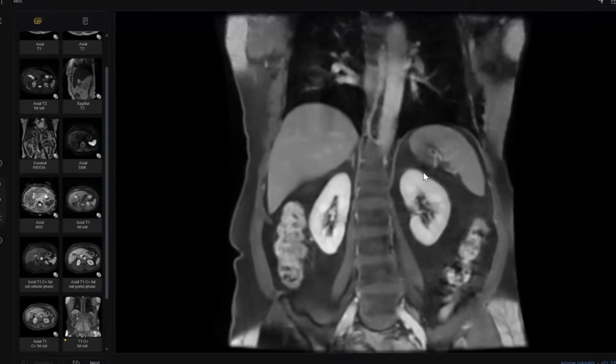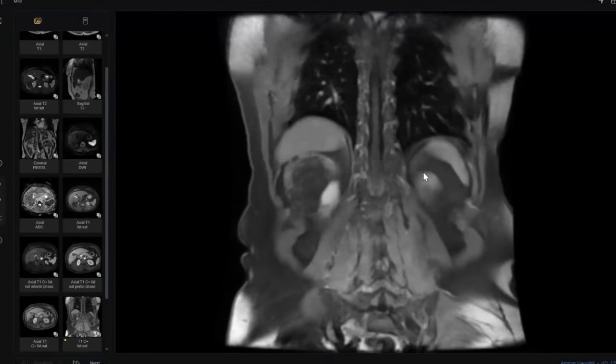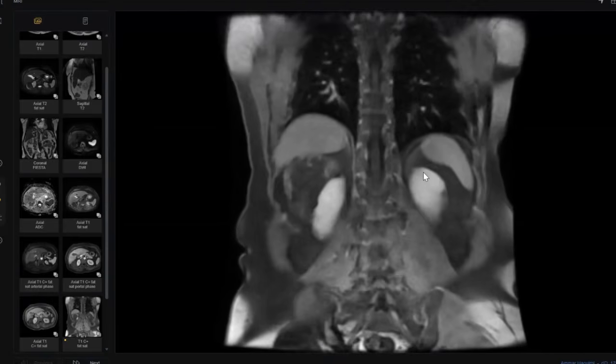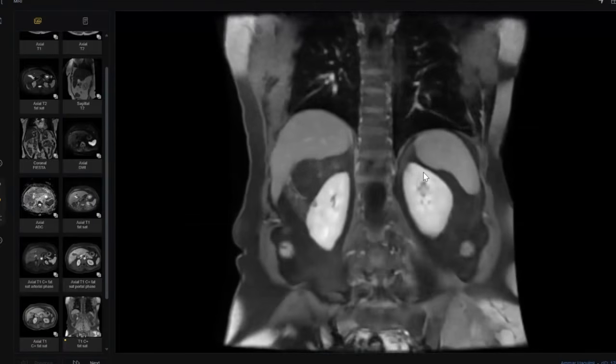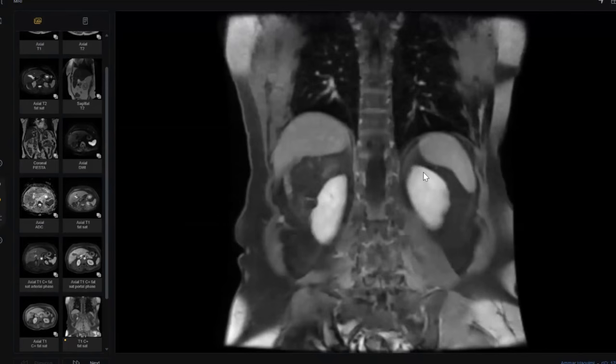Sir, that can be a metastatic deposit from a liposarcoma, might be from a previous malignancy or a recent malignancy which he has somewhere else. Give one or two clues and the final diagnosis.